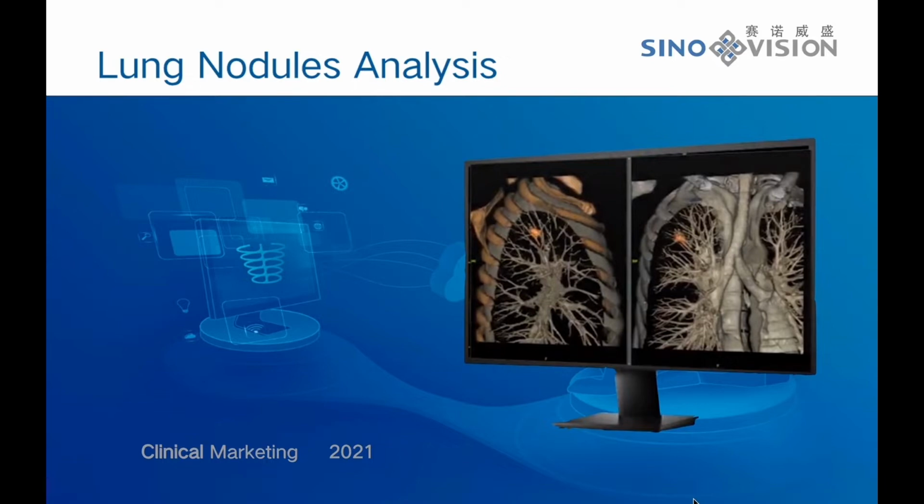Now I will introduce the function of the Lung Nodules Analysis plugin, abbreviated as LNA. This plugin is applicable for the analysis of lung nodules with a diameter of less than 3 cm. It can extract and measure single or multiple lung nodules, and generate diagnostic image reports.